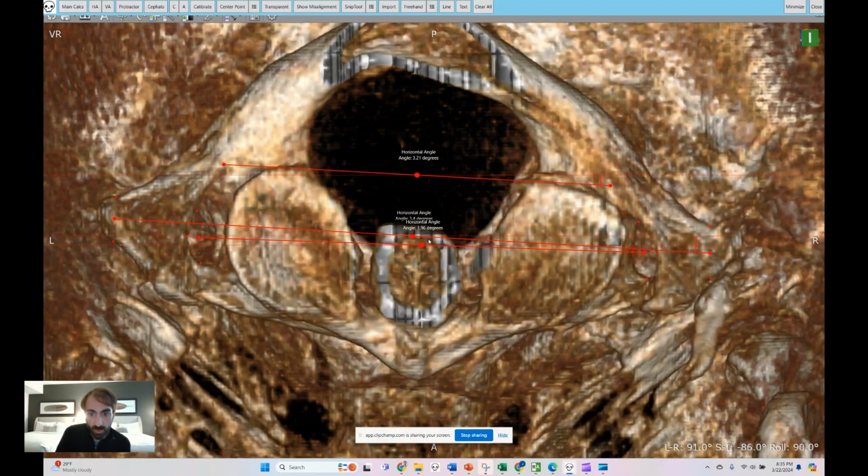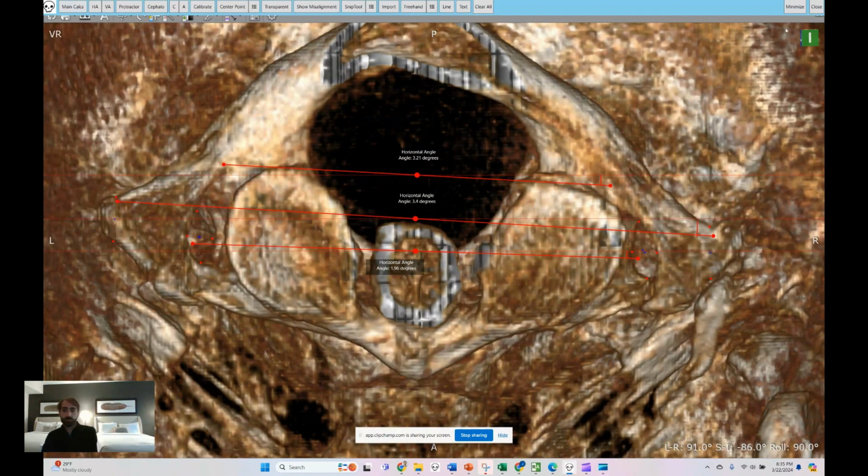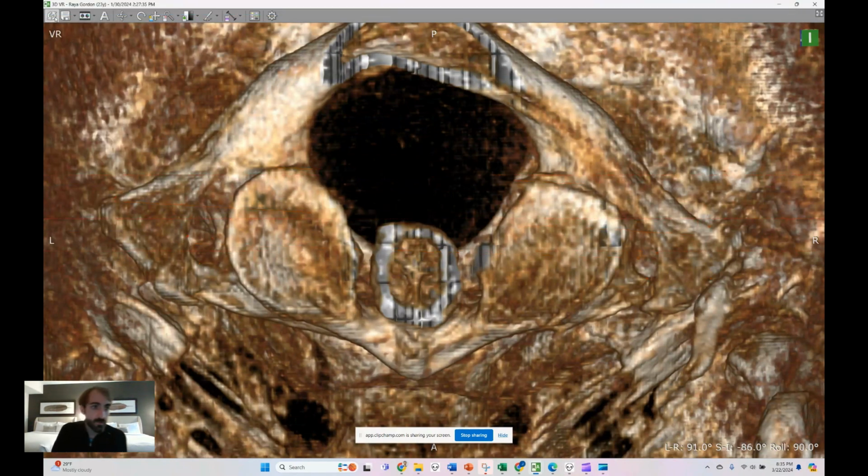is most important. They're all saying that this is anterior. On the right, this looks more consistent. I'm going to say it's anterior on the right by 3.2. Atlas is anterior on the right by 3.2. Okay, 1, 2, 3, 4 measurements left to go. Refresh.